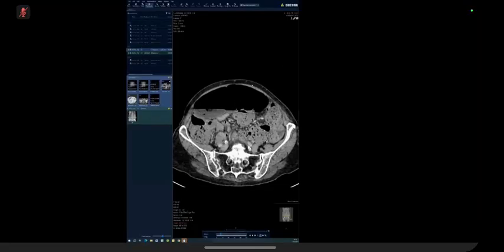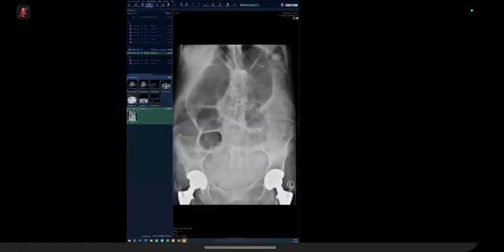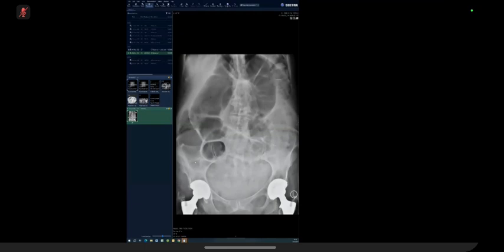Okay, let's go back to the abdominal X-ray. I'll point to specific loops, and I want you to guess which one they are. What colon is this? Right ascending colon, yeah. So this loop that's a bit transverse, this one that's going that way. What is that? I think this can be the distal ileum, or yes, this is the distal ileum.